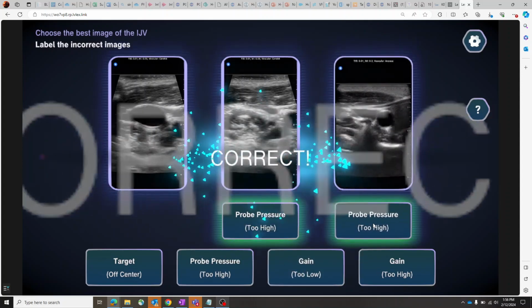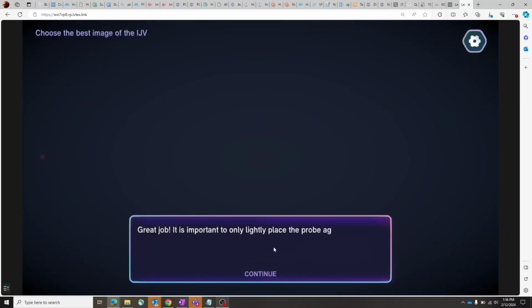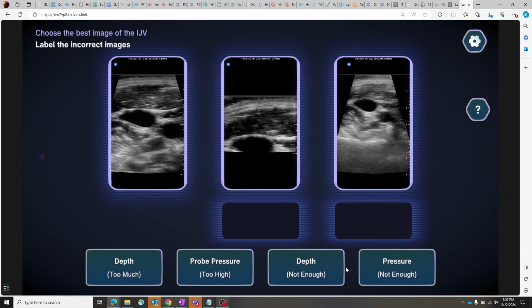By doing this, now we have a really great representation of what ultrasound looks like across a wide range of applications. So, for example, here we're varying the frequency, and you can actually see the visibility of the different calibration dots show differently at different frequencies, meaning true to life, where you're able to see further depth if you set the simulator to a lower frequency, and vice versa.